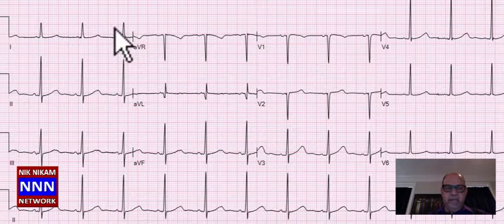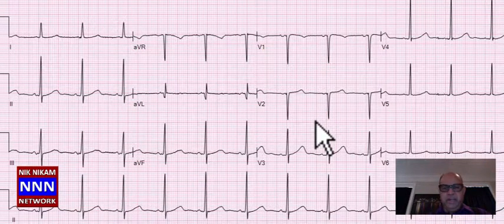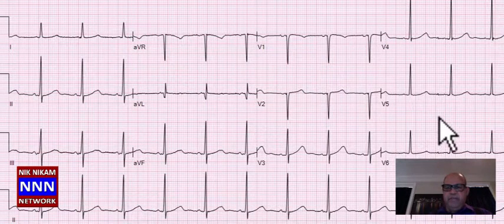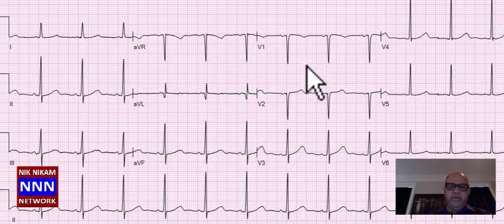Sinus rhythm, high anterior looks okay. Inferior, non-specific T wave changes. Anteriorly, this may be mostly related to lead placement, because the rest of the electrocardiogram looks pretty benign. I would worry about lead placement, otherwise you have to call this an anteroseptal myocardial infarction. Laterally, there are flat T wave changes. So this is sinus rhythm with non-specific STT changes and perhaps old anterior myocardial infarction.